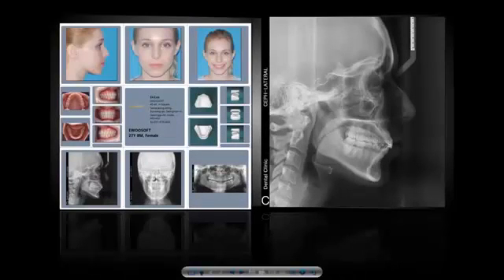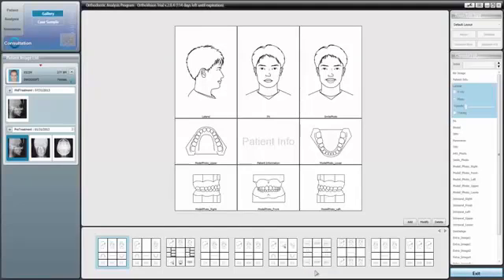Finally, you have the option to customize this gallery by simply clicking on the Setting button on the bottom of your screen. Here we'll see the pre-made slides listed across the bottom, followed by a larger view at the top. At any point, you can create your own by clicking Add, or modify a selected one by simply clicking Modify, or delete the form altogether by clicking Delete.